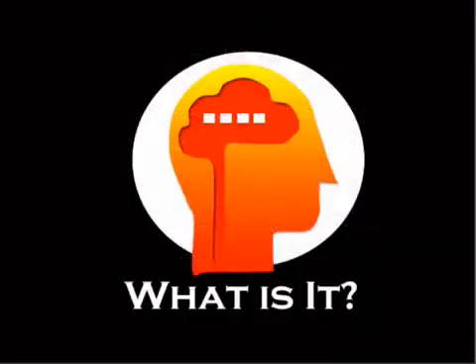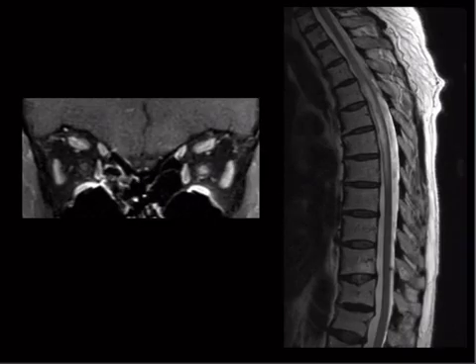All right, next case. Another demyelinating thing. There's nothing on this specifically that would tell you that it was demyelinating other than the fact that we're talking about demyelinating stuff. Now, a couple of things I want to point out here. One is, you see the signal in the cord? Look how long segment that is, okay? So MS tends to be short segment. What do I mean by short segment? I mean like one vertebral body level. This is the long segment. So this in itself could be lots of stuff.